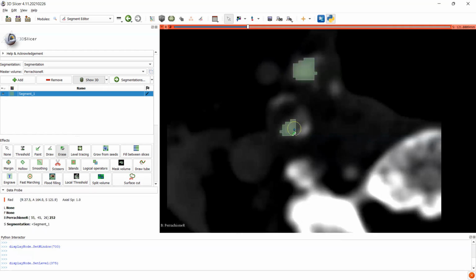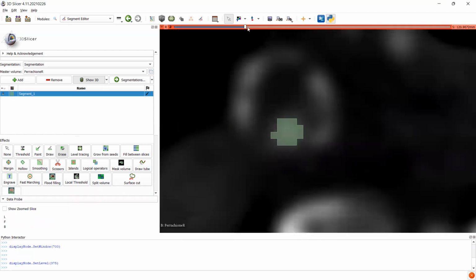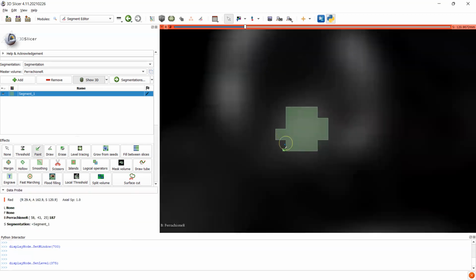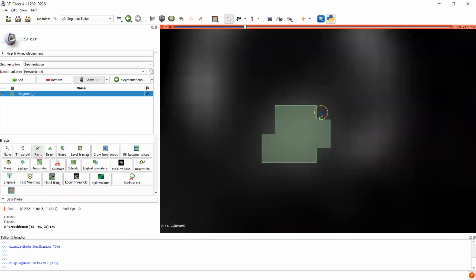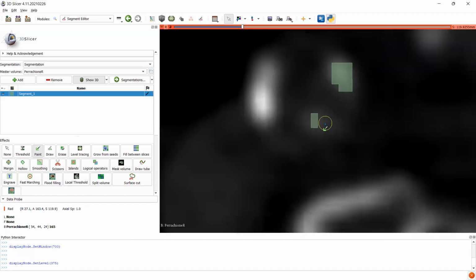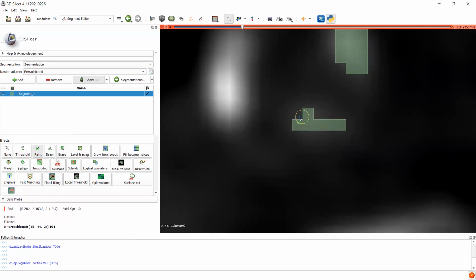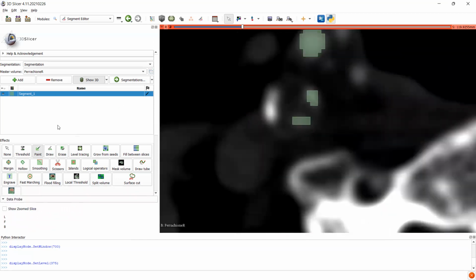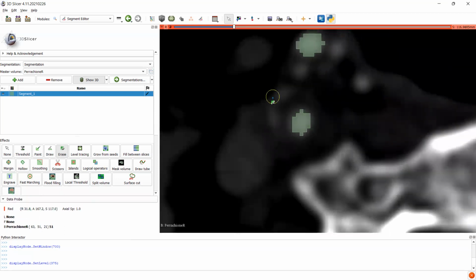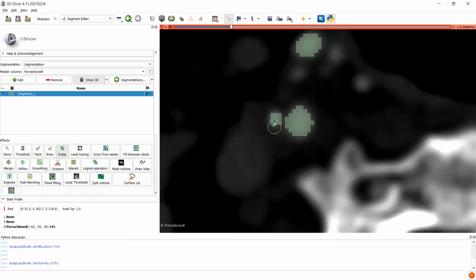Again, if you segment two of the flow channels, it's going to create a hole, and that is pretty unworkable in the CFD part of what we do after we generate these geometries. So you can see here Slicer probably underestimates the flow lumen. I'm gonna remove this here. And you can see this flow lumen disappears pretty abruptly. It goes over here, stays over here, moves over here.